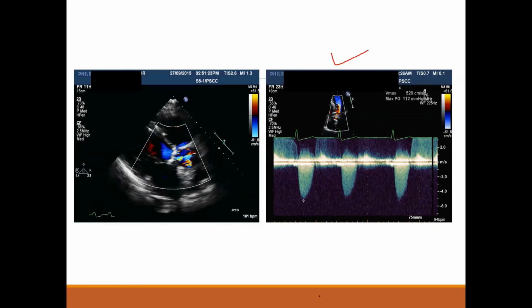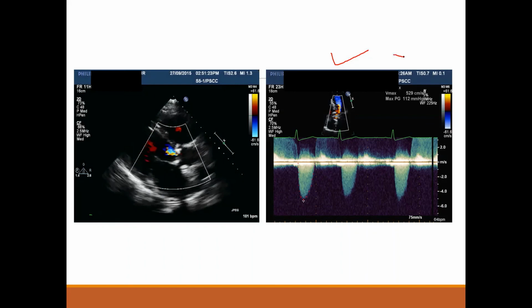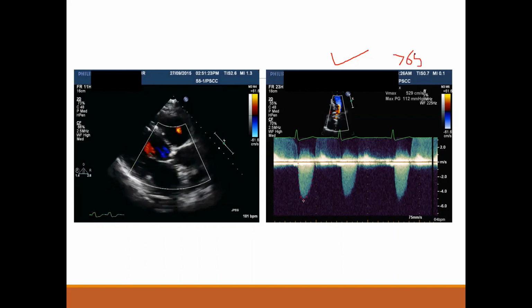And just, yes, a last word about aortic stenosis. The mean gradient is obtained by tracing the outer border of the jet this way, and you will get the mean, which in this case might be something like 65. So it is severe aortic stenosis.